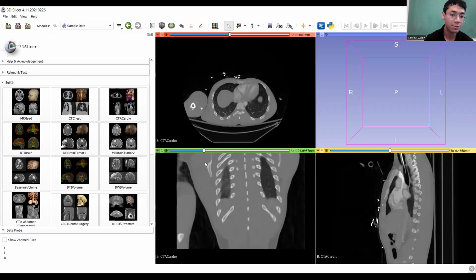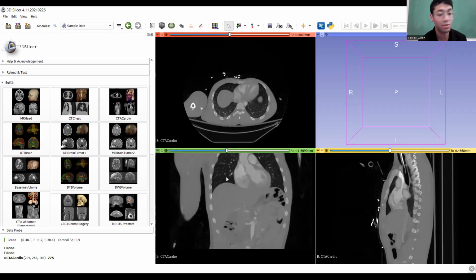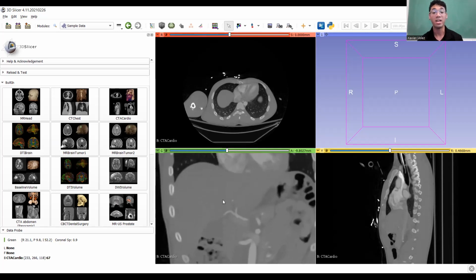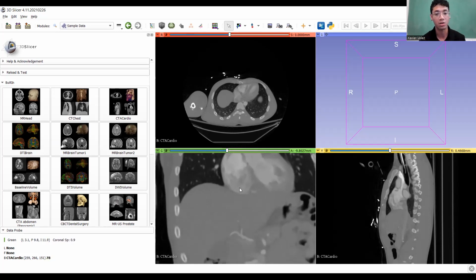I can tell you right now, if you do a quick Google search and ask where the liver is, you'll find out that it's actually a little hard to see, but it's kind of like this structure right here. And this is what we're going to be primarily working towards segmenting. Another reason that I chose the liver for this workshop is because it's really hard to tell that this is the liver. The lines between what is and isn't the liver are really hard to see.